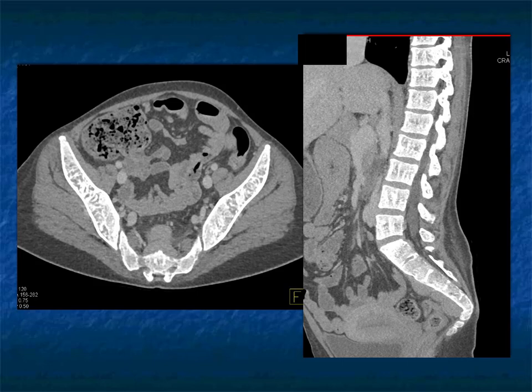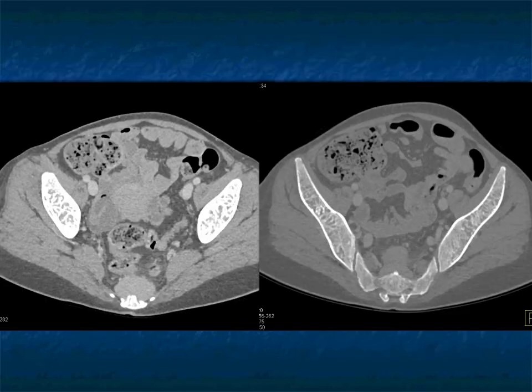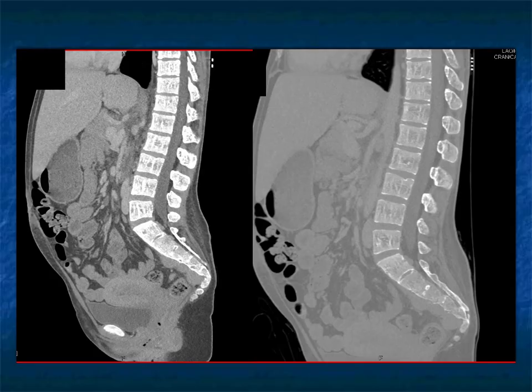Well, maybe you say it's myelofibrosis with bone involvement, but usually it's more diffusely sclerotic, not this appearance like a bone in bone. And myelofibrosis can give you a big spleen and can give you the soft tissue mass in the presacral space. Now, of course, what is that presacral mass? If it was the only thing I saw, I could even say chordoma, but that presacral thing in the presence of bony changes, in the presence of splenomegaly, and the way it's lobulated, that's a really nice example of extramedullary hematopoiesis.